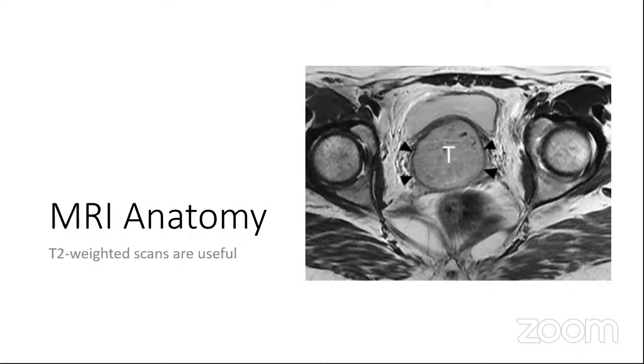So what I'm going to discuss now is the MRI anatomy, and to see what the extension of the tumor is. I'll not discuss the CT anatomy separately. I'll jump onto the contouring software and discuss alongside what the common findings in a CT scan for cervix are. And of course, we're not going to discuss PET CT. That discussion would divert our attention to much broader areas, and more often we don't encounter PET CTs in cervix scans, so I'm not going to discuss that.